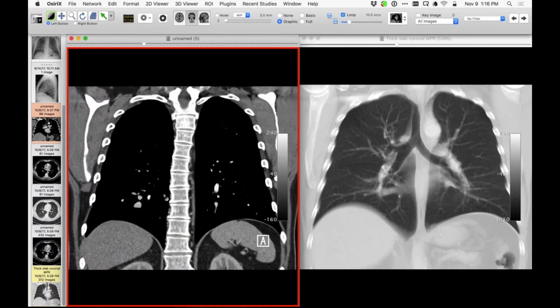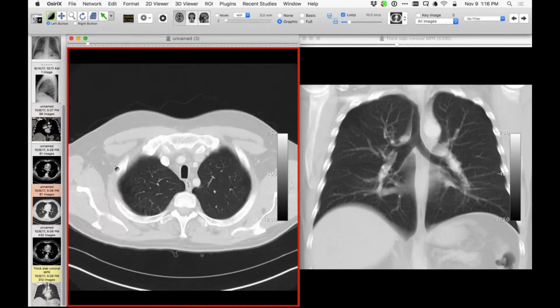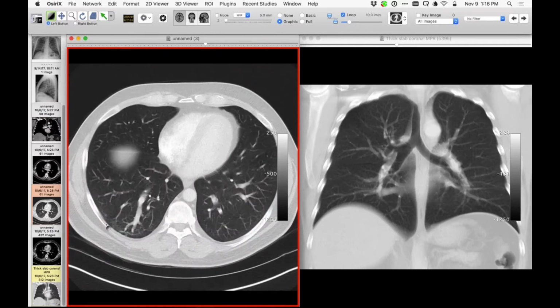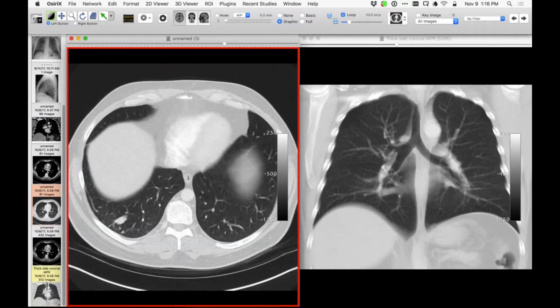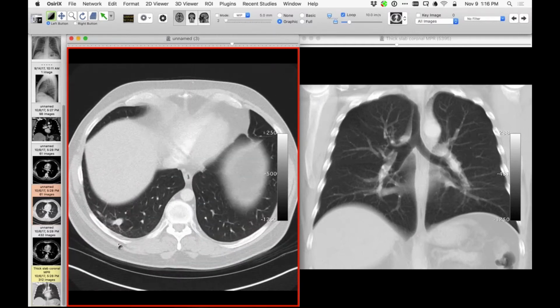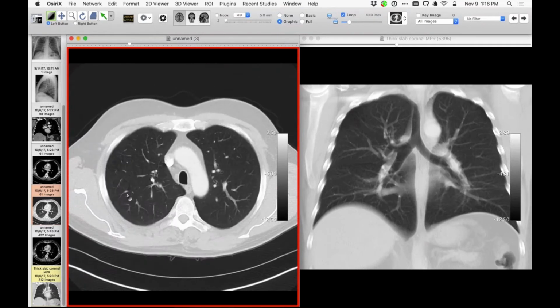Howard, I'm trying to understand why it's so big. Is it draining a larger? I don't know. What's it look like on the lung window settings out in the periphery? If you go to, yeah. There we go. Let's see if it's doing anything unusual in terms of what it's draining. To my eye, it's not draining anything unusual. It's just a couple of large veins here that join to form the fat one. I don't perceive anything else unusual about it, or anywhere else, or airway abnormality, or does anyone else see anything funny?